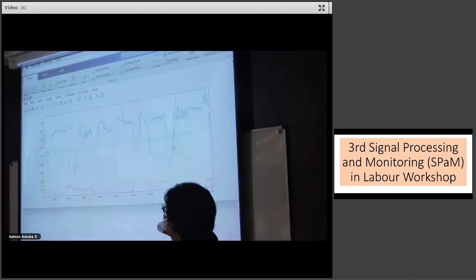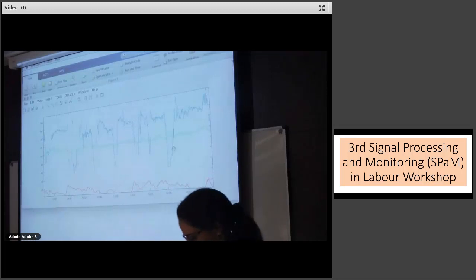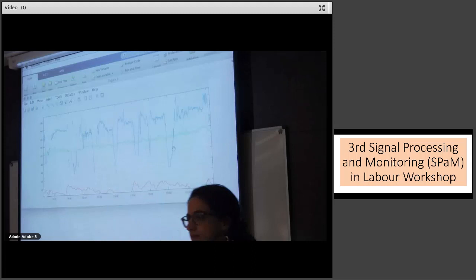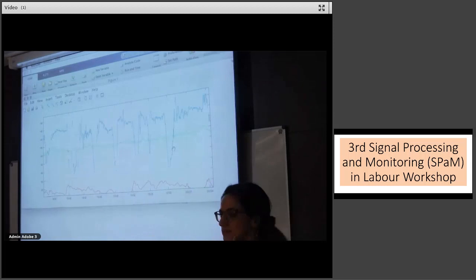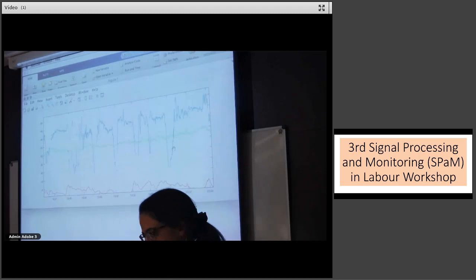The real physiological late decelerations arise from impairment of gas transfer across the placenta, and those decelerations are not usually this sharp drop, sharp rise. They're usually almost U-shaped. That is when, and only when, the relationship with the contraction becomes relevant. If you follow variable decelerations, some of them will meet that criteria. In other words, the deceleration will kick in after the contraction. At other times, they coincide with the contractions. So you're saying you're not worried about late variables? Exactly. Okay. Yeah, that is true.